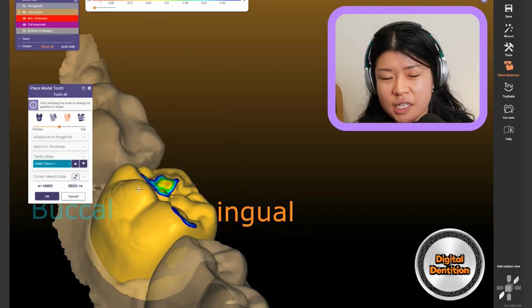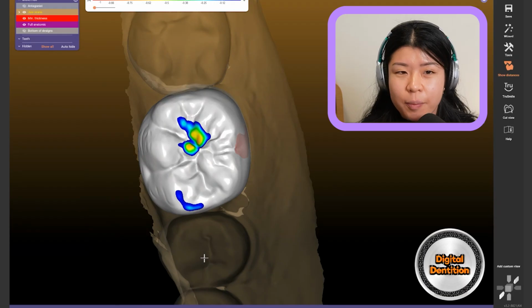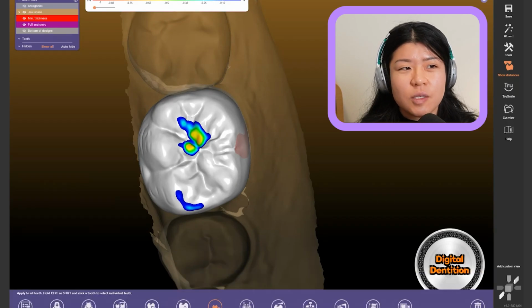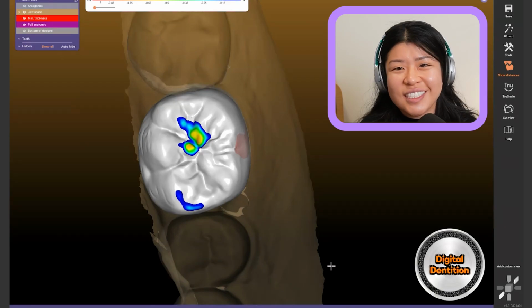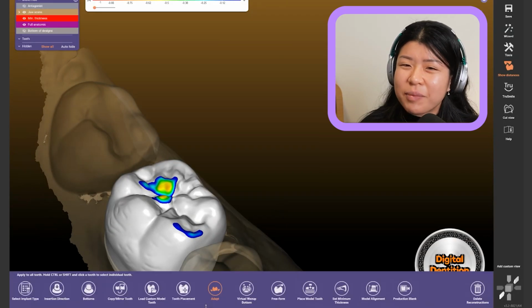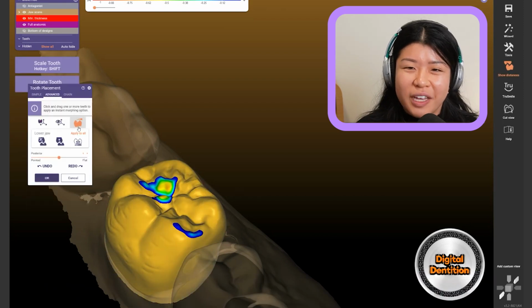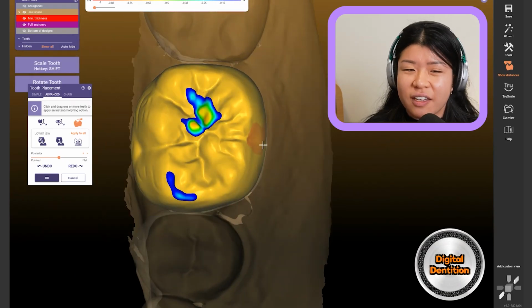okay, we've adjusted our settings, you've got your tooth, you've chosen a tooth that seems to fit that space based off our library, with nice broad contacts, positioning it, lining it up. This was a tip that I got from my principal dentist, but it's just something so simple that you don't necessarily think of. Like ensuring that your fissures are in line, and then your buccal cusp, the slant of it, is in line with the teeth in front and behind. You can get really tunnel vision just looking at it from one view and not actually assess how it sits in the whole arch. That's what you're assessing when you're doing your tooth positioning, right?